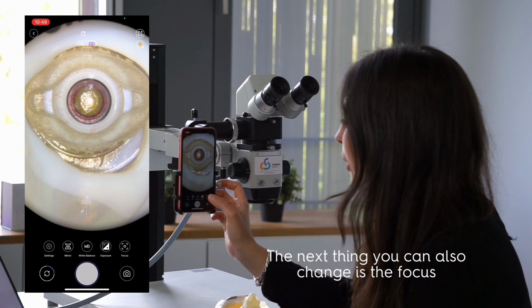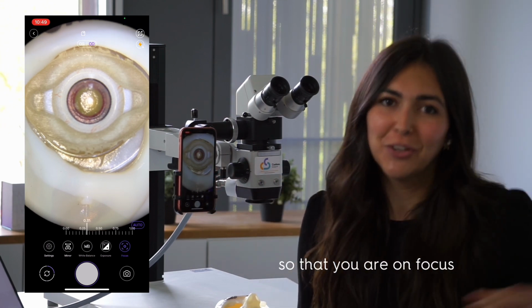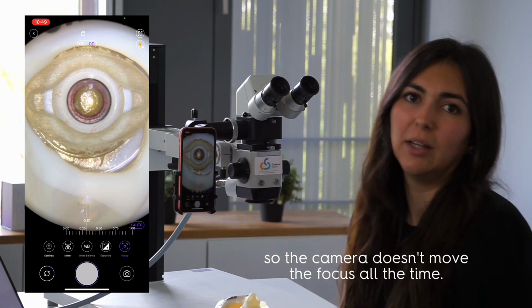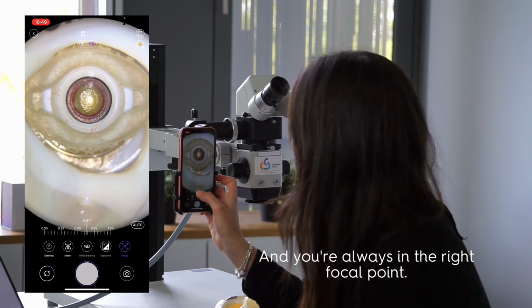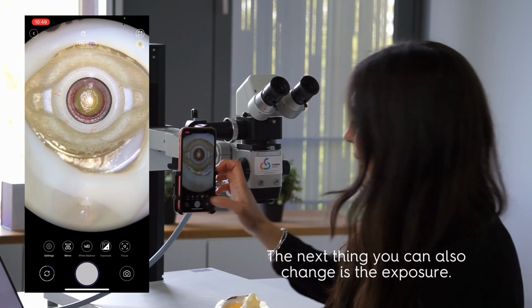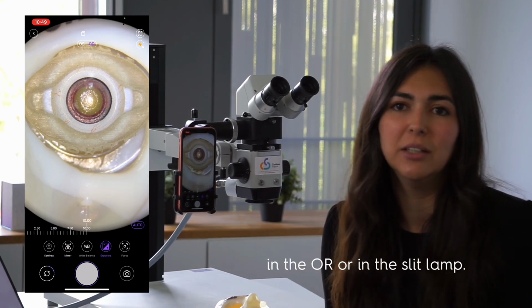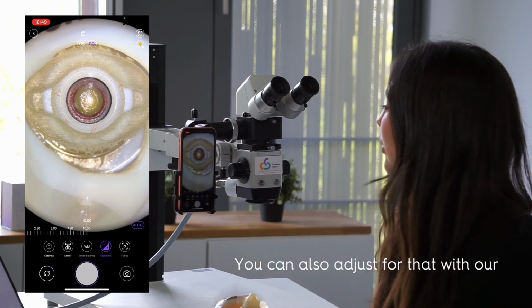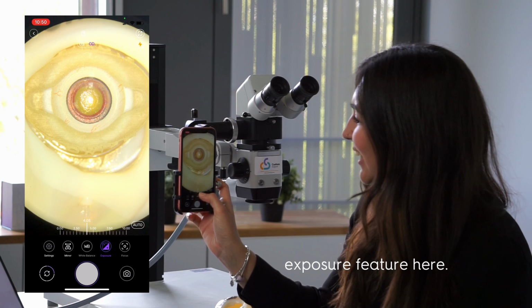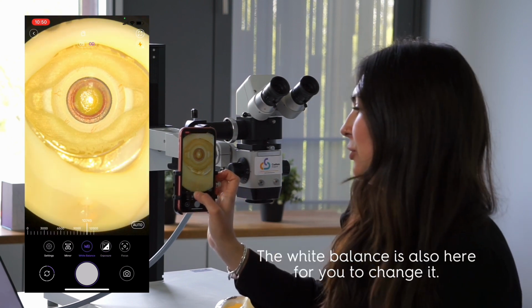So the next thing you can also change is the focus, to make it manual focus so that you are on focus on the same thing you are on the oculars. So the camera doesn't move the focus all the time and you're always in the right focal point. The next thing you can also change is the exposure, just in case the illumination settings are different in the OR or in the slit lamp. You can also adjust for that with our exposure feature here. And the white balance is also here for you to change it.